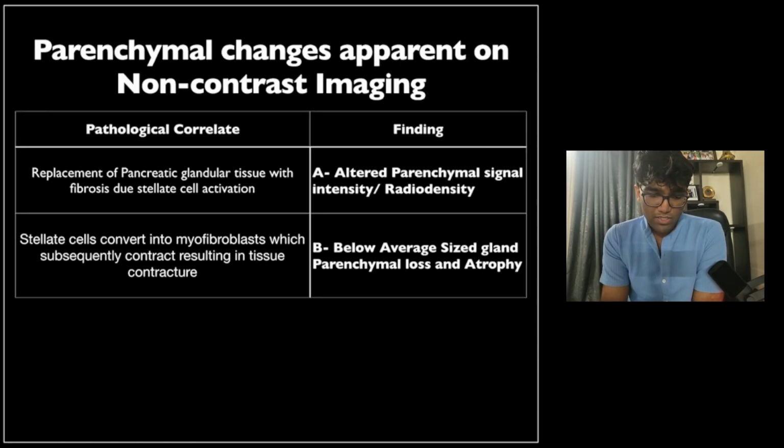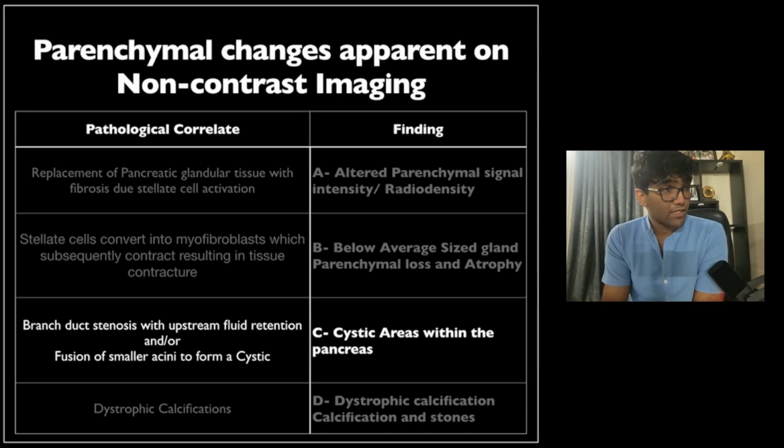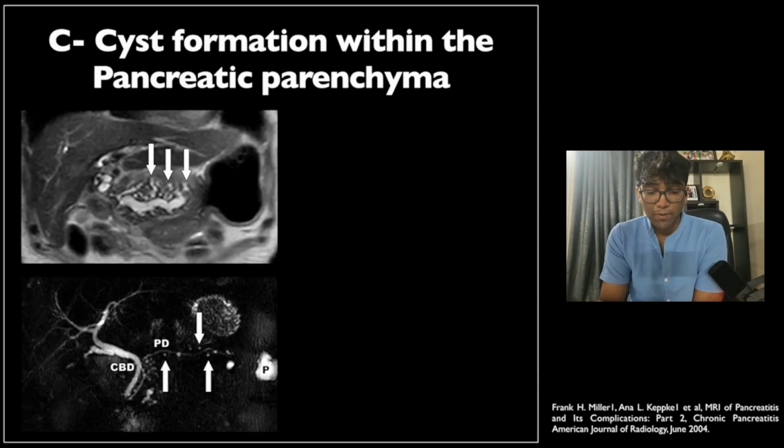Now, parenchymal changes, the next change that we will highlight is cystic areas within the pancreatic parenchyma.